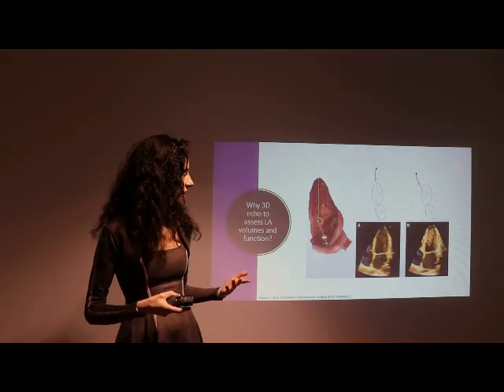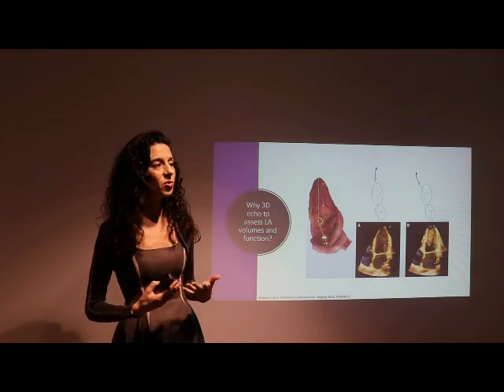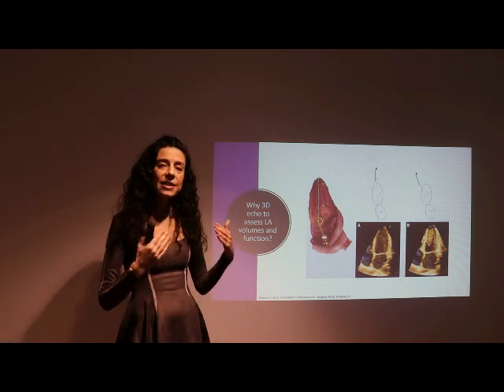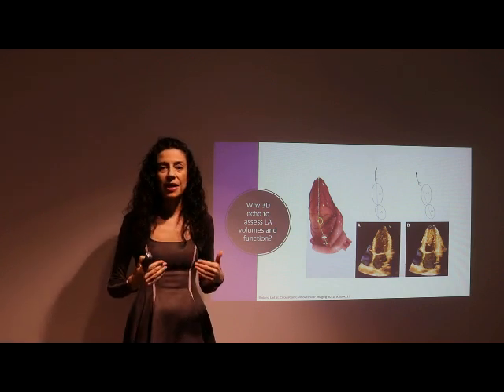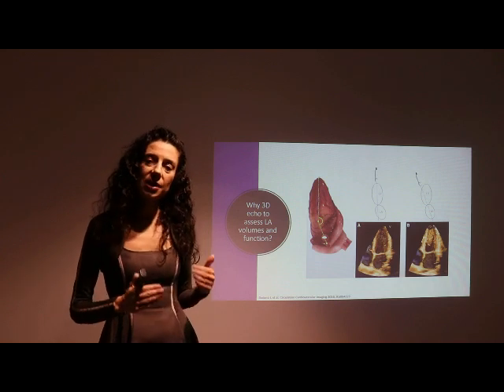Why do we need 3D to measure more exactly the left atrial volume? Because, dear friends, the axis on which the left ventricle and the left atrium lie, they are not parallel to each other, they are not on the same axis.